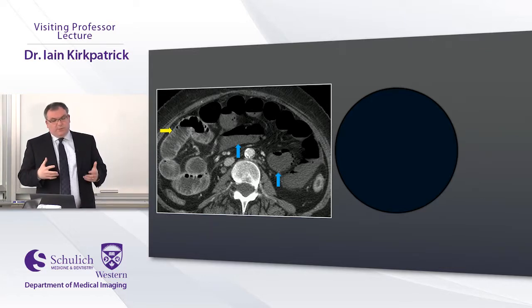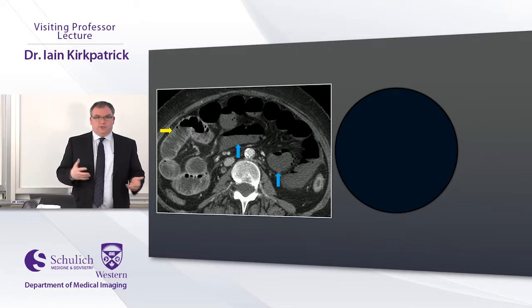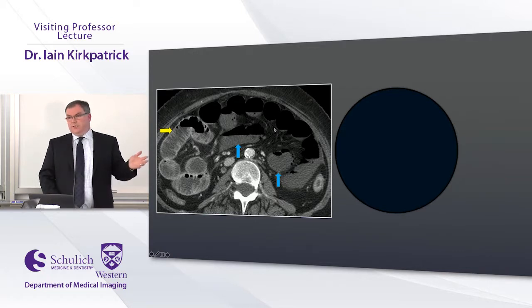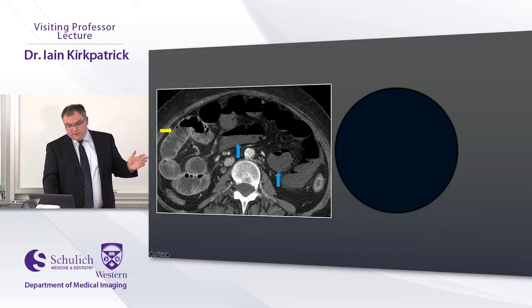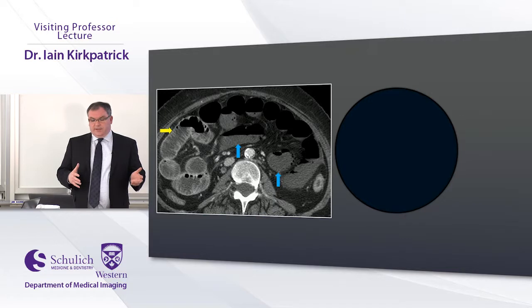It's problematic though. And the reason is, if you recall, I said that wall thickening doesn't usually occur at this point. And if you just take a look at this patient and just take a look at these couple of bowel loops, the wall is really thin there. And I would say it is pretty hard to assess. If you gave me a cropped image of just these two loops, I honestly don't think I could tell you if that wall was enhancing normally or hypoenhancing. A thin bowel wall is one that is really tough to evaluate.